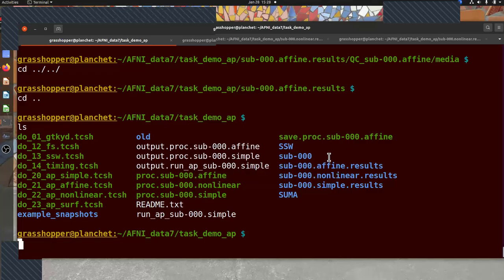All right, so when we just finished there, we'd gone through the qualitative QC features, and now what I would like to do is to look at some of the quantitative ones very quickly. So we looked at the end of the QC. We said that final section beneath the warnings showed this kind of dictionary of useful things from start to finish.